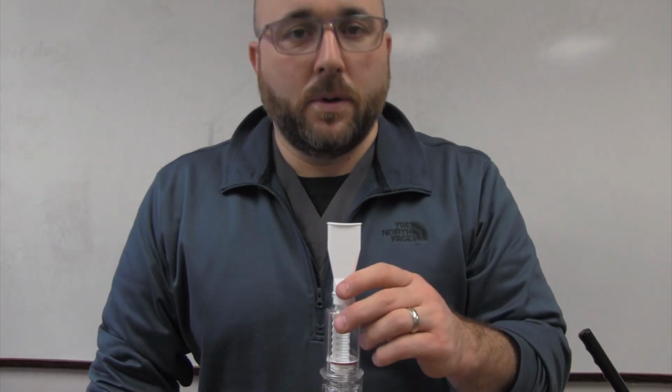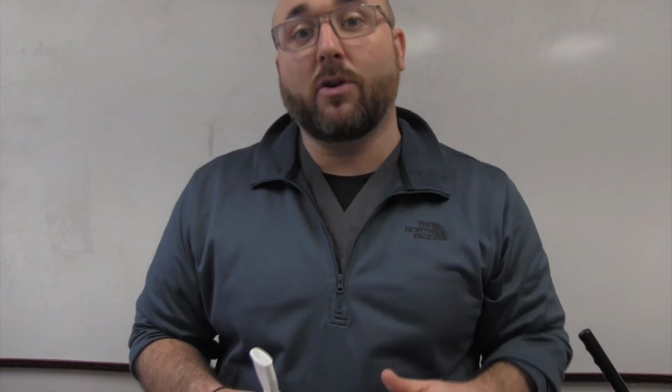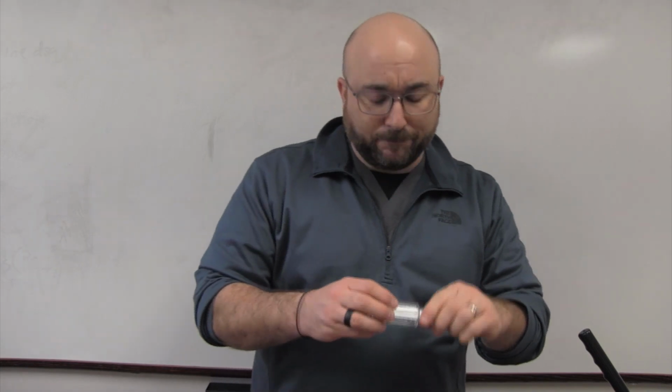So I'm going to exhale, seal my lips, then take my breath in. Whoa, boy, that's hard to get in. So that is really hard to pull against. So if I do that 10 times per hour, that's really going to work on those muscles, and it's going to give them resistance so they can grow stronger. And that's really important, especially if somebody's been on a ventilator, mechanical ventilation, paralyzed for a while. This is a good device for that.